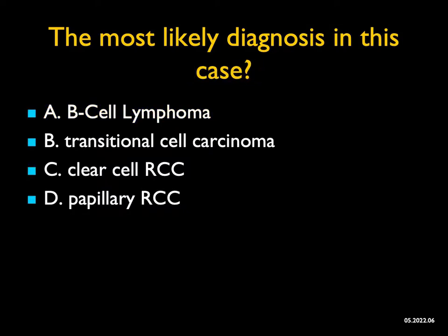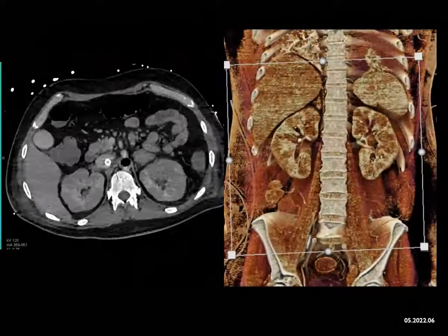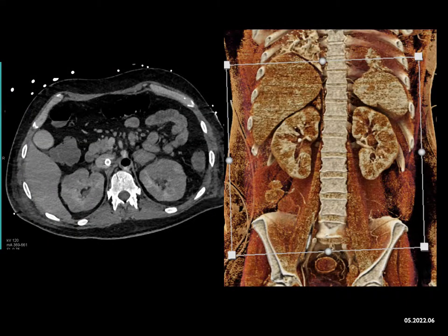The most likely diagnosis in this case is, well, when you look at the kidneys, now this patient is pretty sick, and you can see the patient has an ECMO catheter in the aorta, so perhaps you might say, well, maybe, just maybe it's just poor perfusion. That's a thought, but the more you look at it, you see how it's infiltrated. It's not the appearance of TCC.